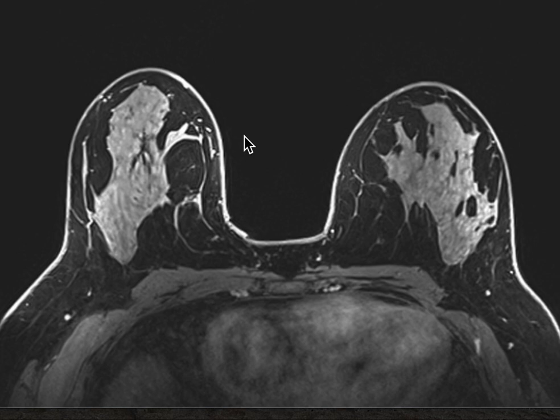This is not a pre-contrast because I see contrast in the internal mammary vessels. Sometimes it's hard to tell by just looking at the heart if it's post-contrast or not, so I look at the internal mammary vessels to see. This one's post-contrast, and you'll have at least three post-contrast images, but I probably wouldn't have more, because you should be able to see everything you need to see on the three post-contrast.